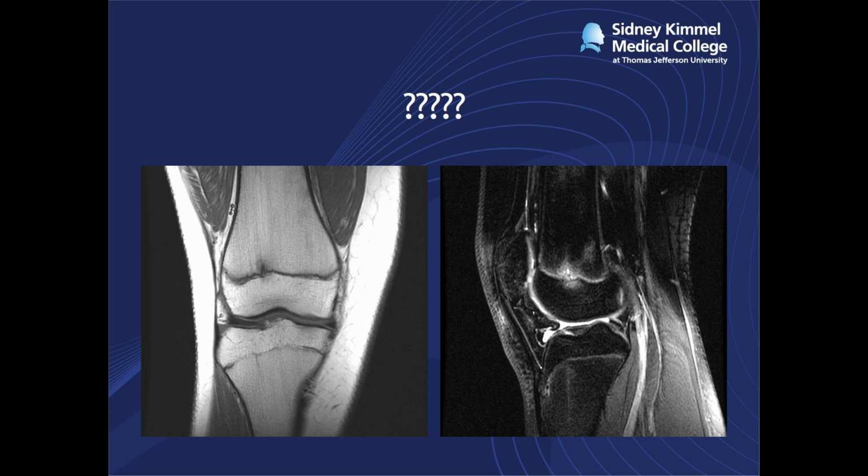But it's something to consider if you have a finding like this and no real other explanation for the injury. I would, in this case, just describe this finding and say it has been described as a source of pain. It's thought to be a self-limiting process and doesn't require any specific follow-up, but it's something that you should be aware of.